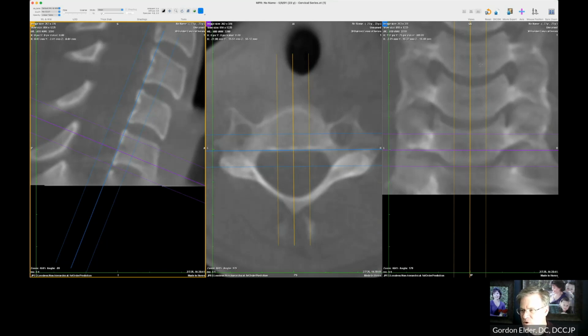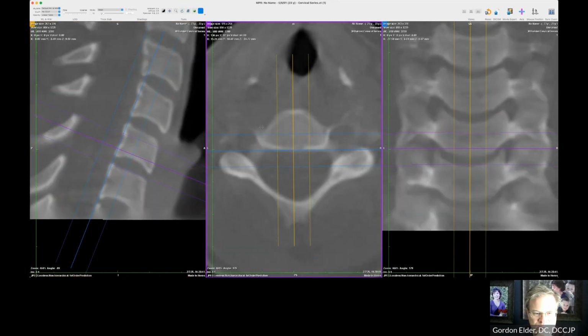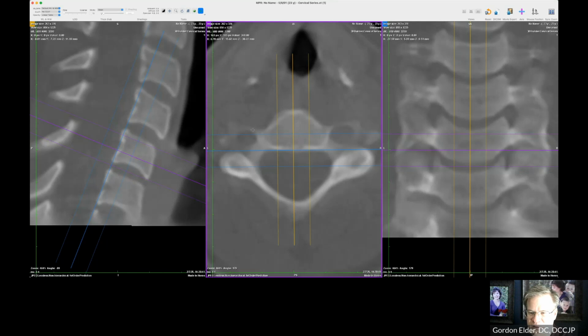Okay, now there's curvature in the spine, and that's probably what's giving us that lateral motion. If I just come straight up, we're going to do it again. Okay, I think this is C5. Now out here, it looks like, wow, okay, that's a little bit forward from there.